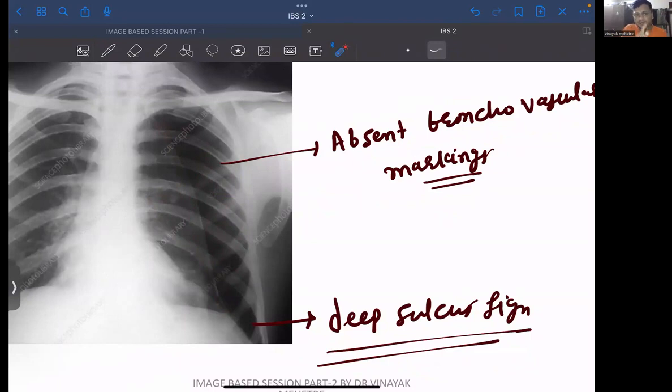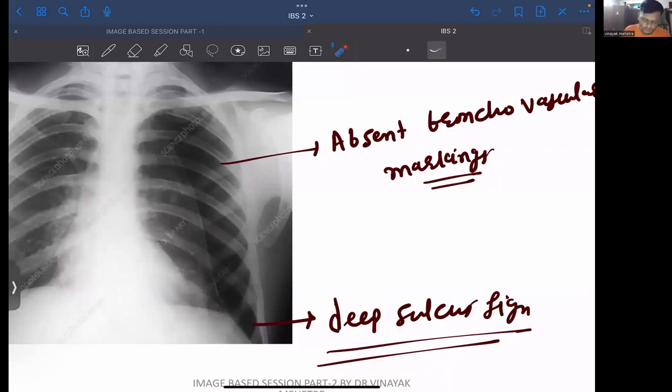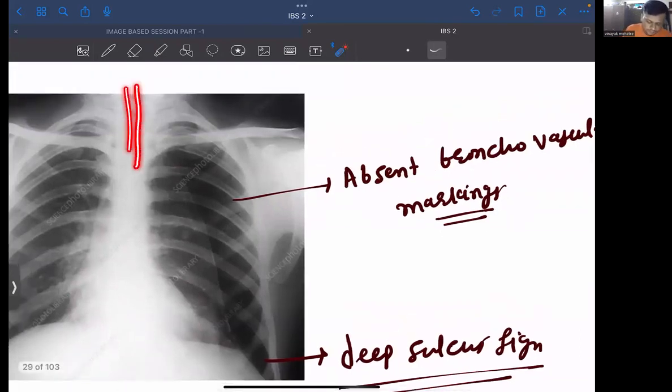And if you have taken a look carefully at the normal X-ray which I have shown you at the start of the class, heart is at normal position. So does the trachea. Tracheal ring दिख रही है?